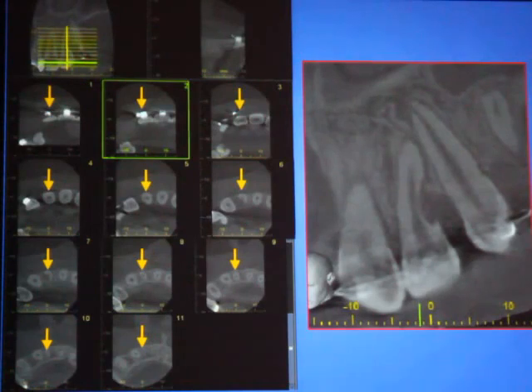So that's why every time you see a tooth on a conebeam CT, it takes at least 15 minutes to check all the slices at a different level in a different view, and it tells us in 3 dimensions what is going on with the tooth, where the defect is, and what is the dimension of the defect.